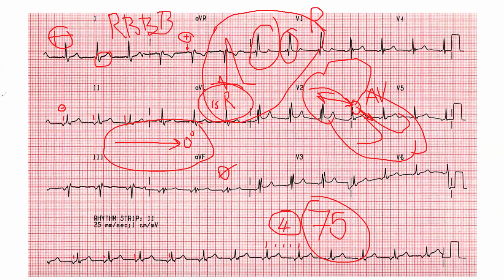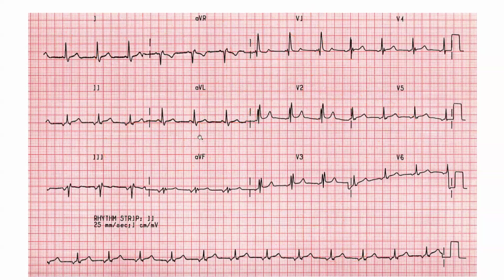Have you watched the conduction abnormalities? Yes. Okay, you should watch it again and you should practice. Yes, you have to understand and you have to follow it. Whenever you do see the M complex, the block is there. Okay, and this is a right bundle branch block. So you do have a junctional rhythm with a right bundle branch block. Okay, let's move on. Yes, that's a good one.